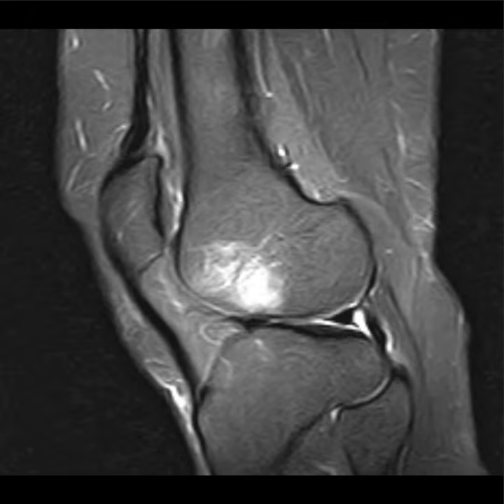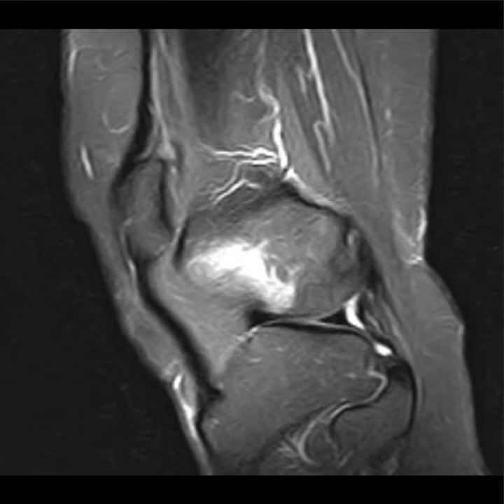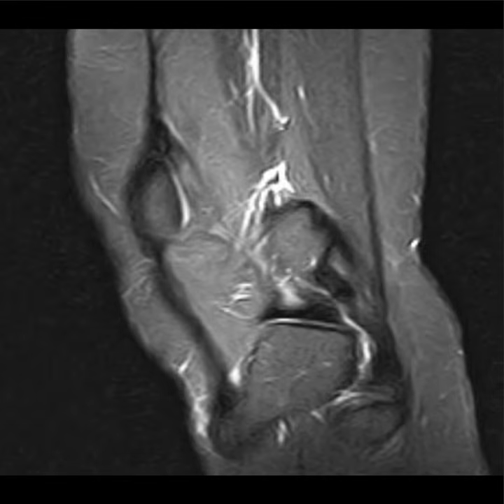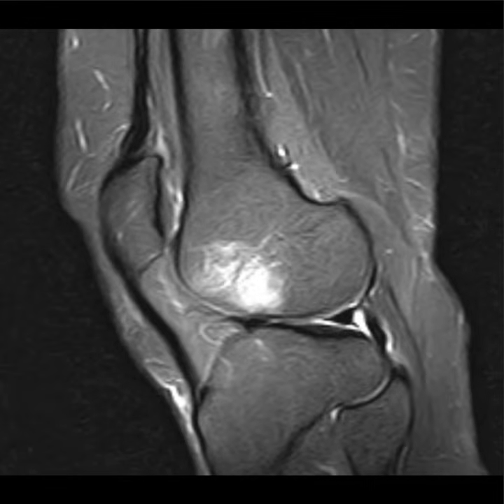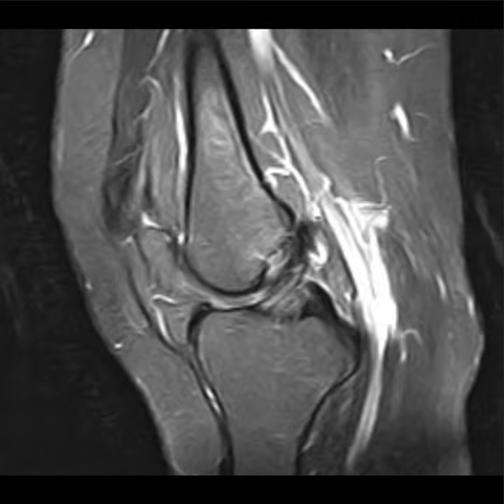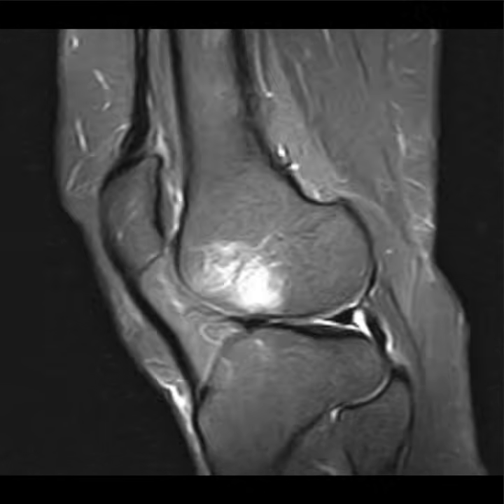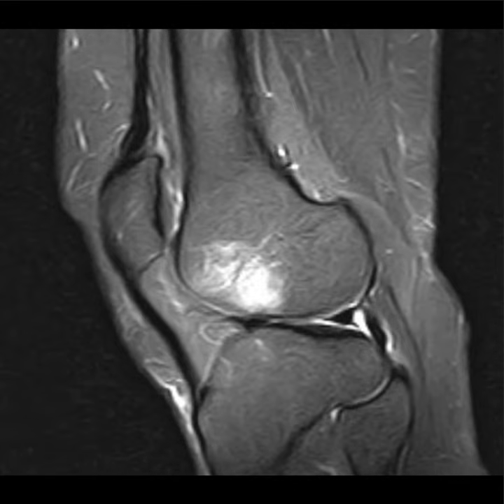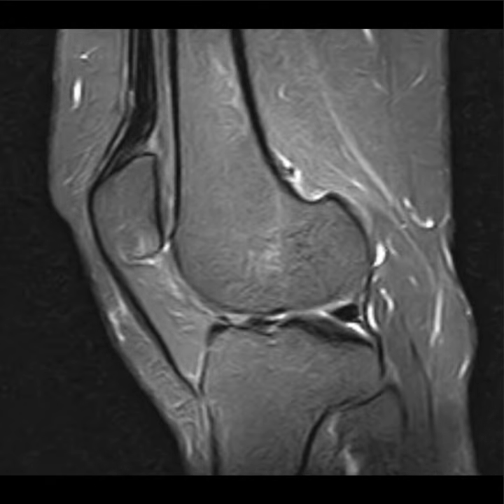Usually it indicates bone contusion, some sort of trauma to the bone, causing the area of bone marrow edema. So what kind of trauma will cause this appearance? Sir, usually I think it's related to the patella. Excellent, good job. So what do you want to do next?